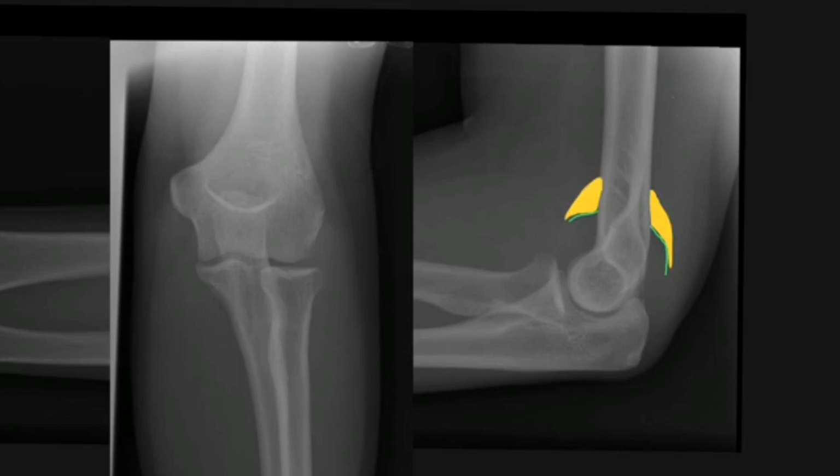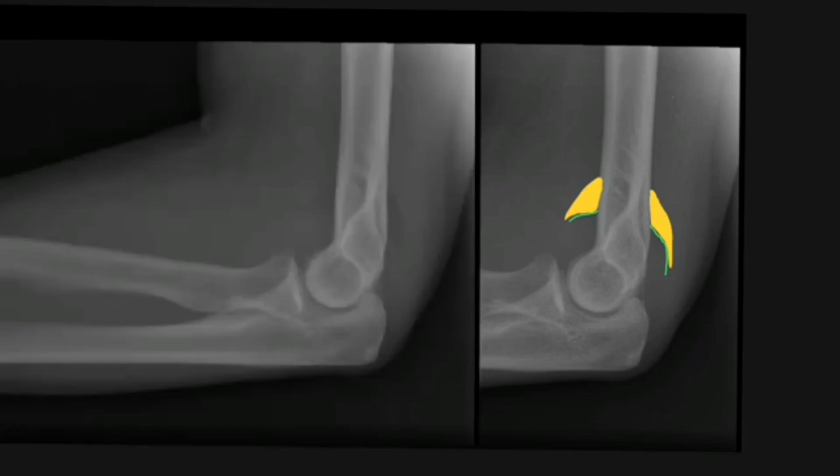This schematic diagram explains why the fat pad looks the way it does. It's been stripped away from the anterior cortex by the joint capsule, which has now moved anteriorly because of the joint effusion. The same is true of the posterior fat pad because the joint capsule has moved posteriorly on account of this elbow effusion. So just to recap, here is the anterior fat pad, which should really be aligned very shallowly in the anterior portion, and the fat pad posteriorly is now visible.